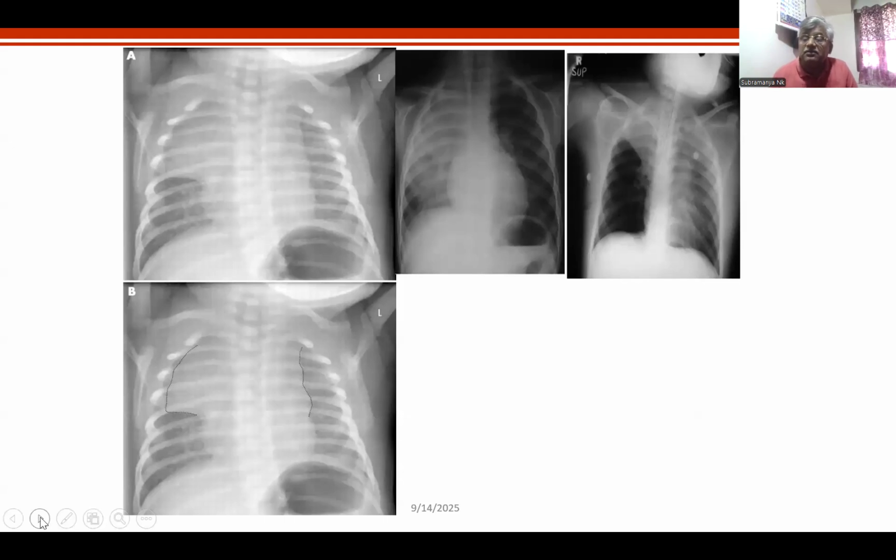This is again another one which shows the thymus but not the collapse. Look here, there is a consolidation here and there is a collapse film here, and why it is a thymus but not a collapse is because of the following signs. Can you see the wave sign?